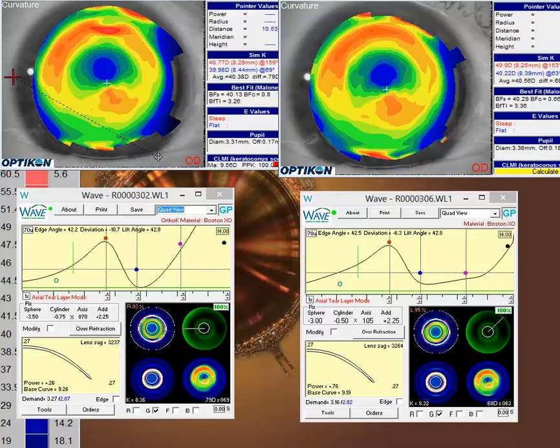So with that said, let's take a look at a couple of your designs here. This first set that you sent us, I understand you sent us a few cases. This first one, I noticed that it looks like you may have designed both the right and the left lens based on right lens topographies. If you look at the information that you sent over, it looks like you've got two right-eye topographies, and it looks like from your image captures that you may not have been able to get a left-eye topography out of that. And that's not uncommon. Sometimes that happens, especially early on when we're getting these topographies. But it sounds like that left one might actually be fitting fairly well for you.